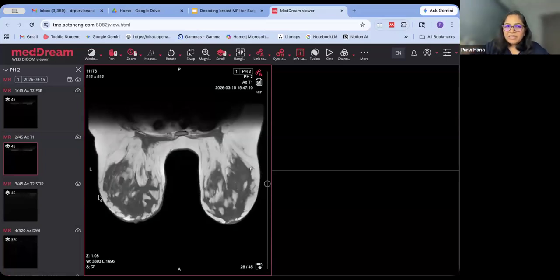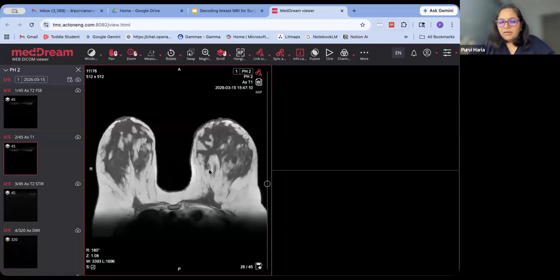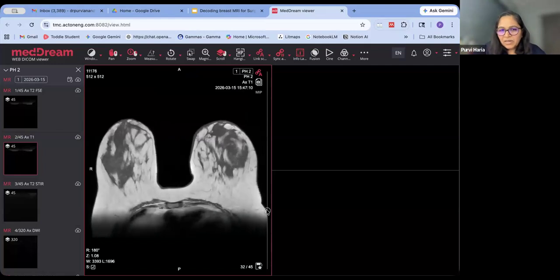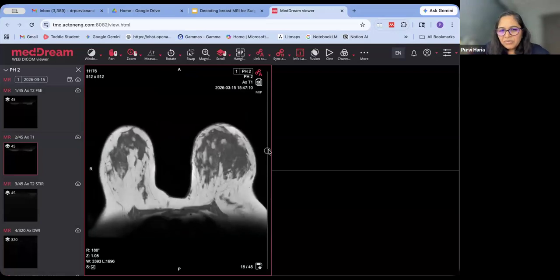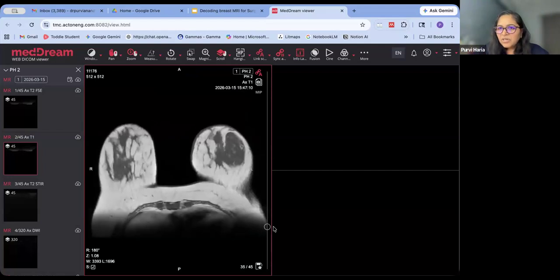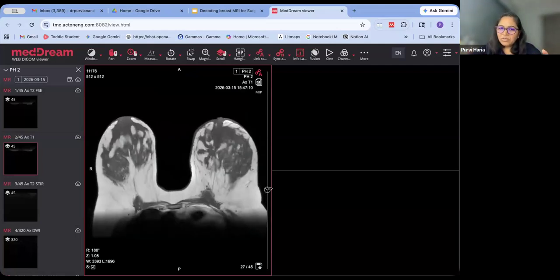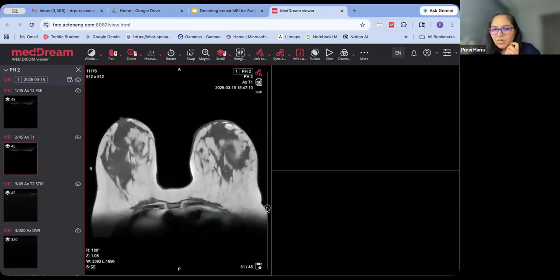Again, in the same way, I'm going to rotate this, because this is sometimes the way that we see the MRs. So you go from top, you see the chest wall, the great vessels, and then you go down, you see the liver. So you now saw from top to bottom, and then in the same way as we see on mammo, the clock position. So from the top, when you are scrolling on the images, you will see it.